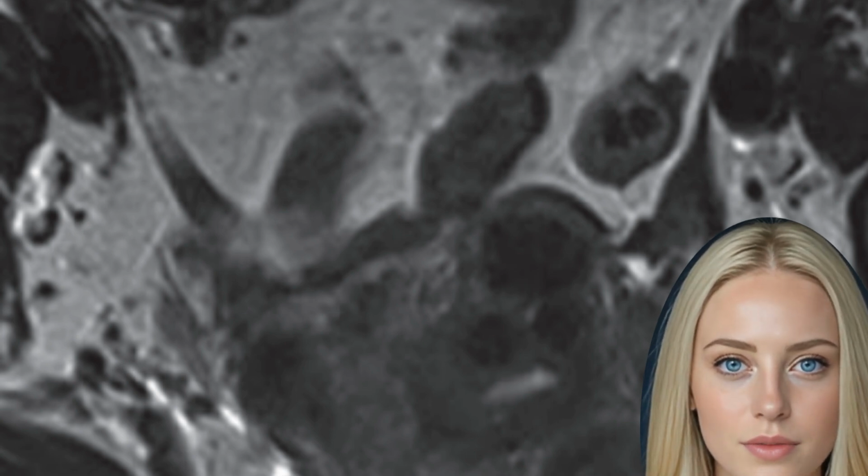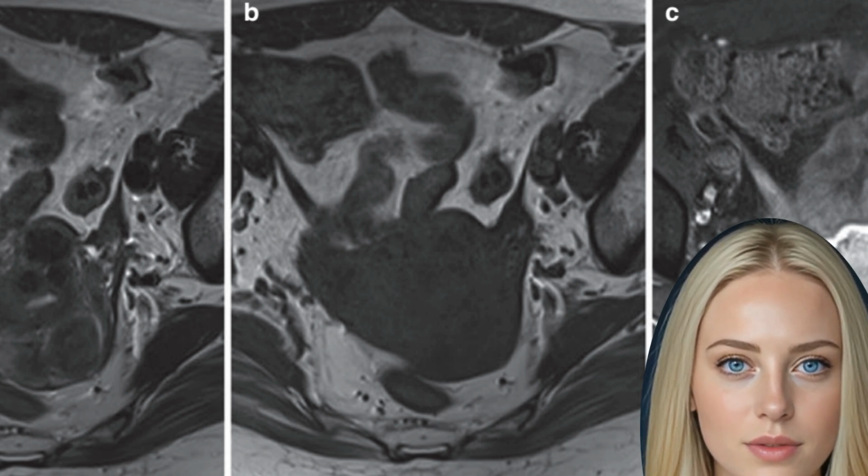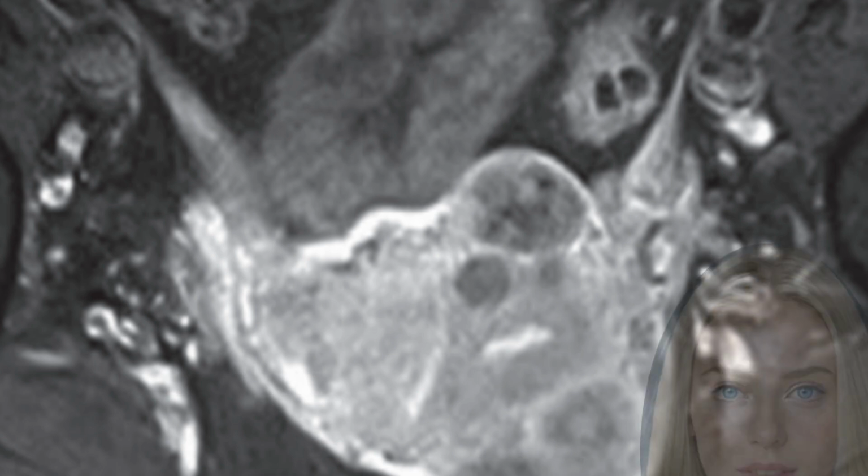In those cases, MRI is able to visualize the uterine corpus on its whole extent and free of superimposition. Using MRI, an adenomyosis characteristically shows a thickened junctional zone of more than 12 mm, the norm being max 5 mm, hyperintense spots on T1WI and microcysts.